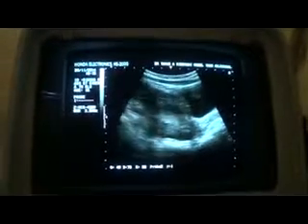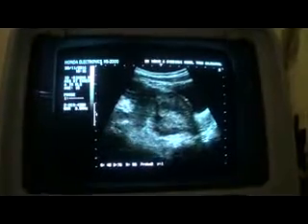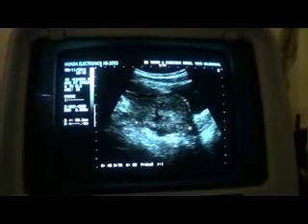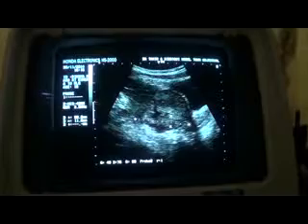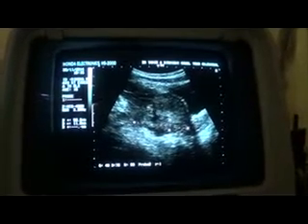Coming to the pelvis again. Now you see this is a thick mesentery, this region, this area. This is thick mesentery, and this is representative of omentum, thick mesentery, fluid in the pelvic cavity, the uterus.